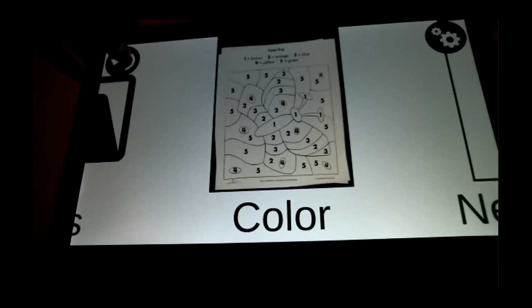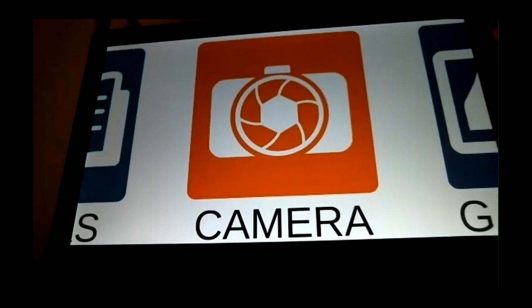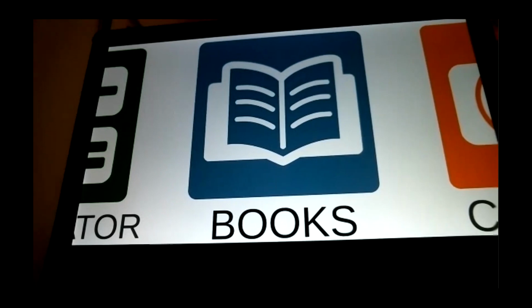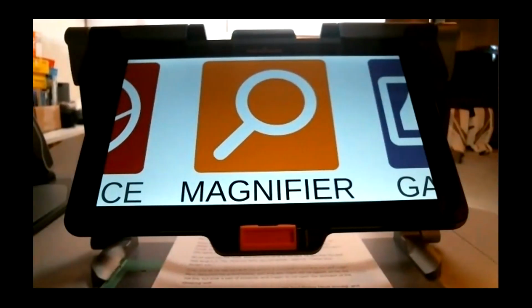So good, I've also shown you that all this can be done on the Reveal 16. And what we try at Humanware is to use the same look and feel for all our products. If you know one, you should know the other products. So let's hope, because I've got one more nice gesture that I want to show you, and that is to toggle to different applications in the Android system and back to Android.